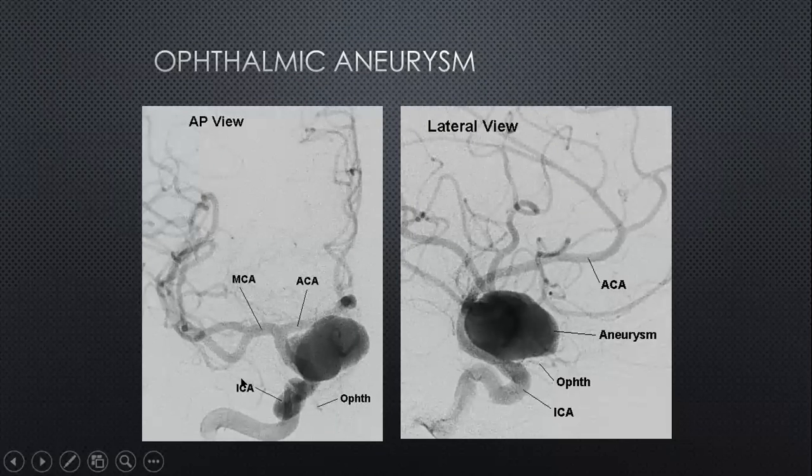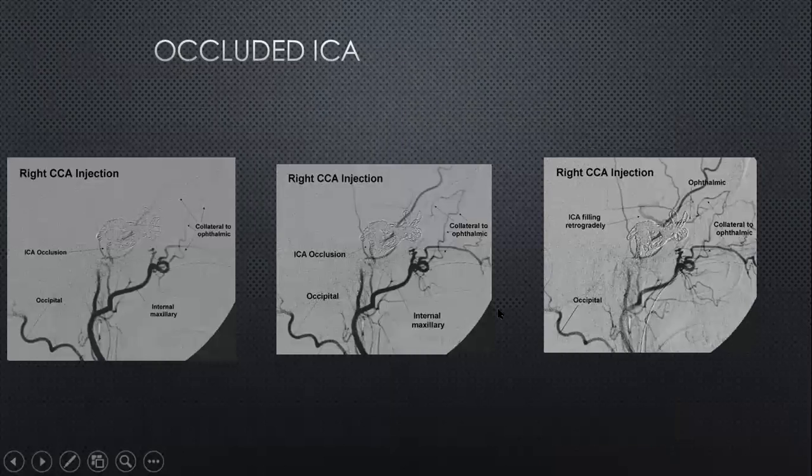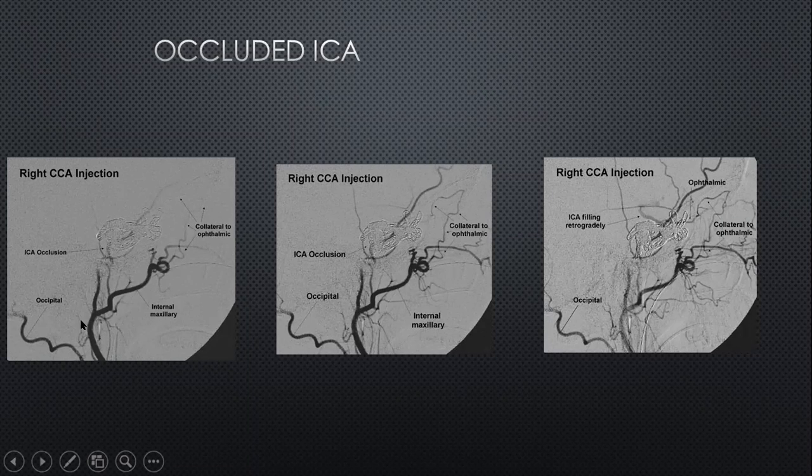More traditional appearances of pathology in this area, of course, are the aneurysm, and probably more of this with Dr. Hilditch, so I won't spend much time. But to realize again the importance of this ophthalmic artery, this is a patient who has had treatment of a carotid cavernous fistula, where we have actually occluded the internal carotid artery. This is sacrifice of the internal carotid artery over here.